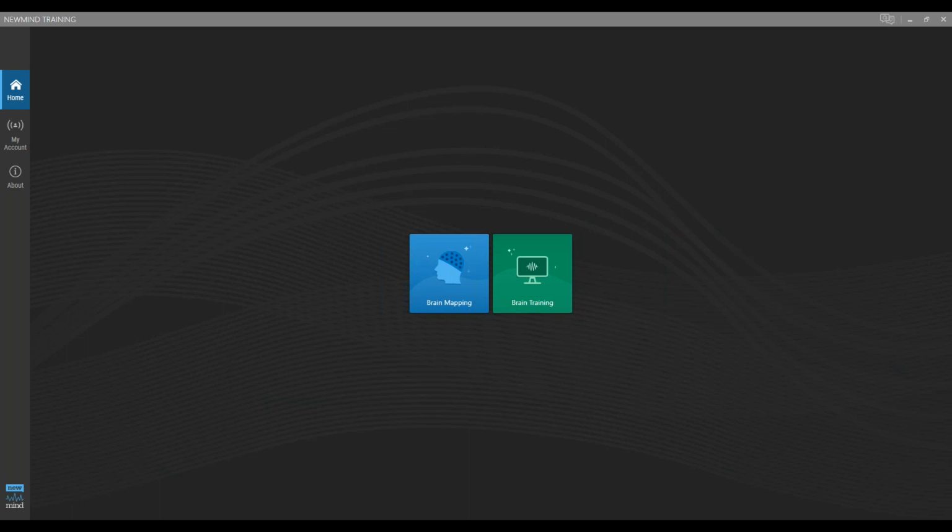So maybe we've got their target percent set too high. Maybe it's just that area of the brain not ready to respond yet. So if I had that same situation but a low training efficiency, that's when I would get worried, and want to look into it further and make some changes.